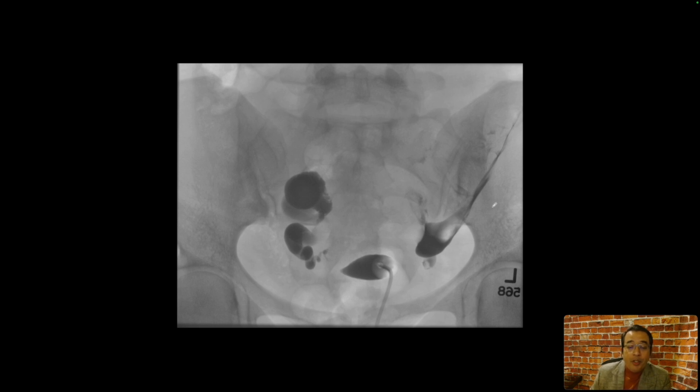This single image is from a hysterosalpingogram. We see the catheter with the inflated balloon in the lower uterine segment, and the contrast has been injected. This contrast has spilled into the intraperitoneal compartment on the left side. We see that right here. And on the right side, we see this curvilinear focus of contrast accumulation, and this is the fallopian tube that is dilated and distended with contrast, making the diagnosis of a hydrosalpinx here.